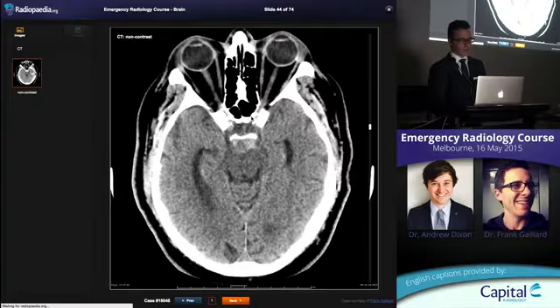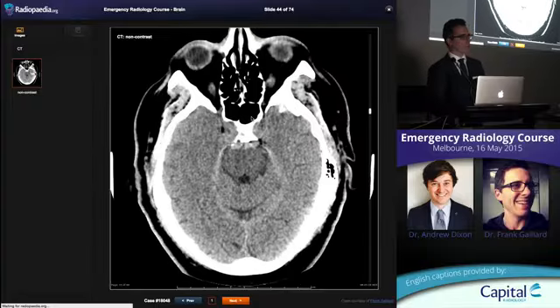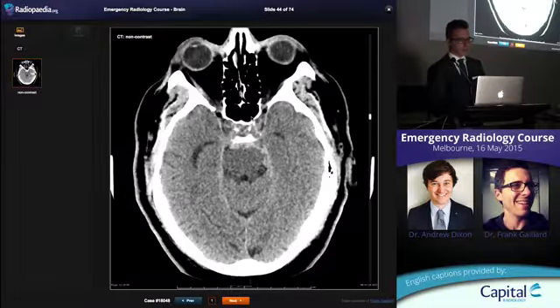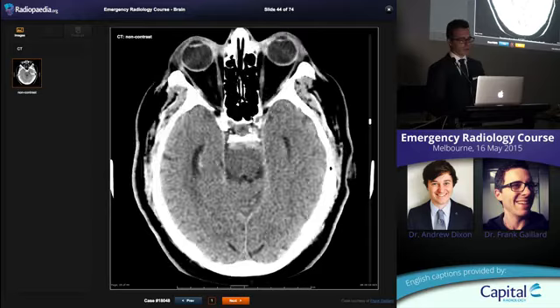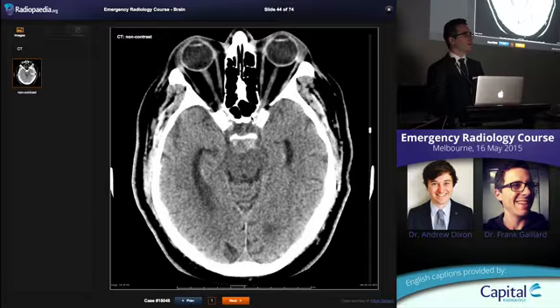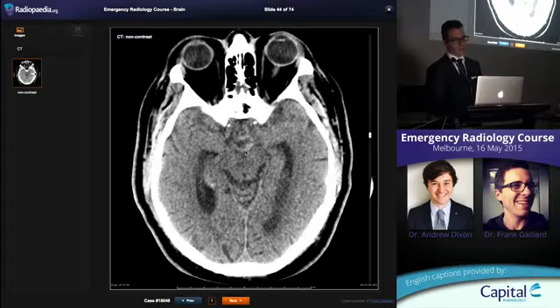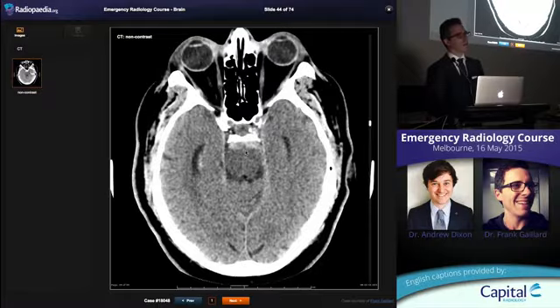This is the pattern of subarachnoid blood where it's hard to know when to stop imaging the patient. But you usually get a clue clinically. This was, I think, a 70-year-old guy working in the shed, lifted something, got sudden onset headache, worst headache he's ever had, but that's about it. He didn't collapse, doesn't have any neurological deficit, went inside, poured himself a double shot of bourbon or whatever, sat home for a while. His wife eventually told him that he should go see someone, comes into the emergency department, you do the scan, and you see all this subarachnoid blood, but he's sitting up in bed. He might be a little bit annoyed by the bright lights, but that's it. And you can do as many vascular imaging studies as you want, you won't find an aneurysm in these patients.